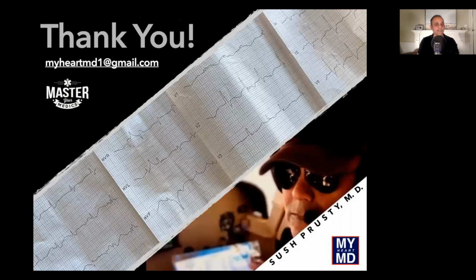This is a case that illustrates the importance in understanding the difference between an inferior STEMI with RV infarction versus an inferior STEMI with a lateral wall infarction.